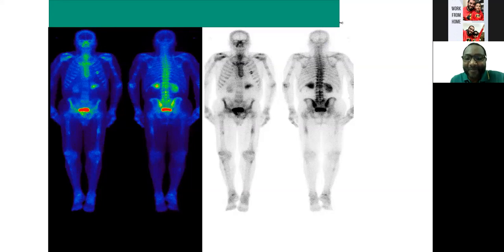Also, I can see uptake maybe from the ankle joint. It is present at the proximal and distal leg, the tibia. So this is a bone metastasis, bone metastasis infiltrating the vertebrae, the upper and lower femur, and also the posterior tibia.